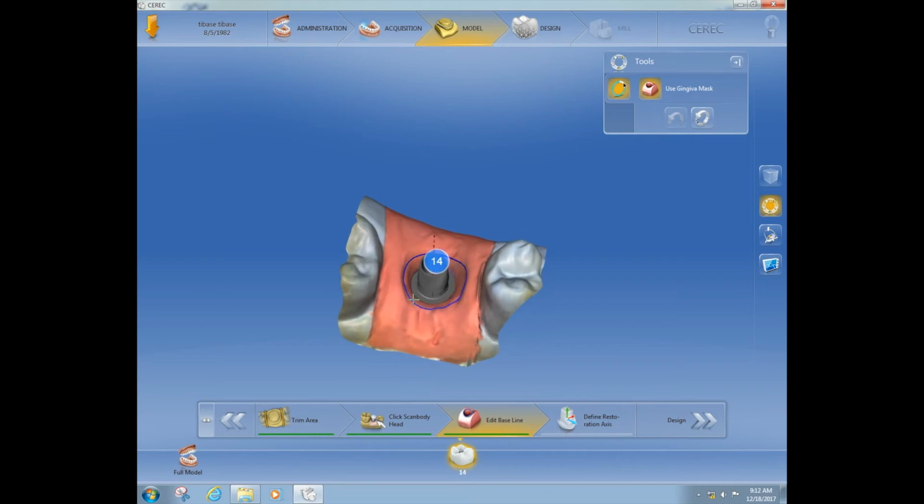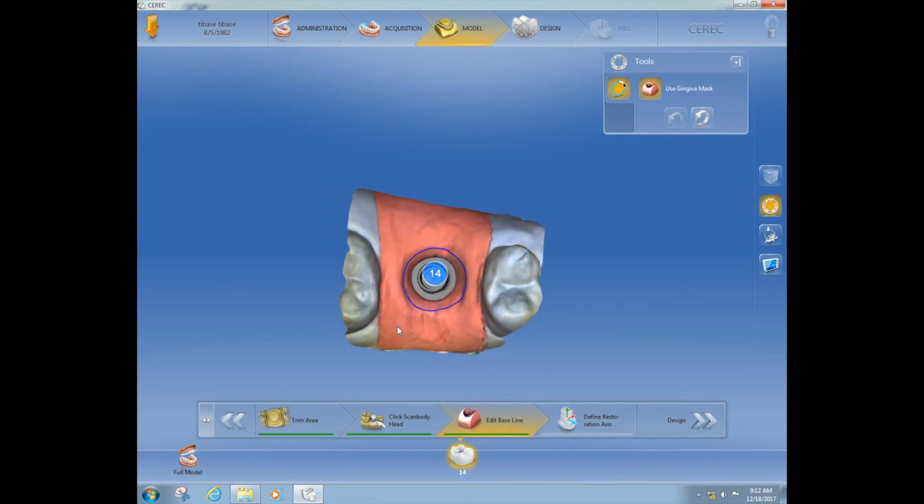Some people like it to put that blue line just on the outside edge of your tissue. On a posterior implant, no one seems to take the time to actually mold the tissue anymore. But if you've got a nice tapered abutment for a healing, like a healing abutment that has some shape, this will actually be formed very well. If it's not, you're going to get a cylindrical tissue form, and then you'll have to either use a laser or some other type of tissue contour.